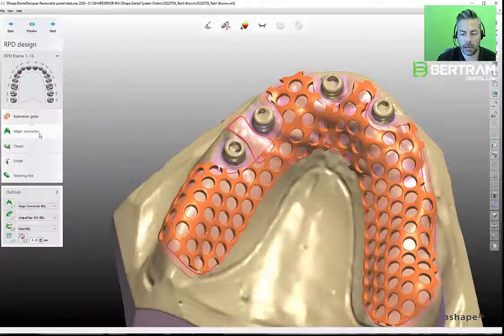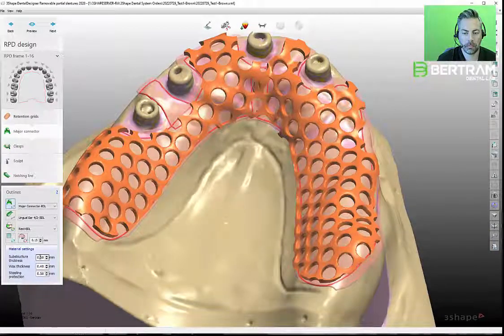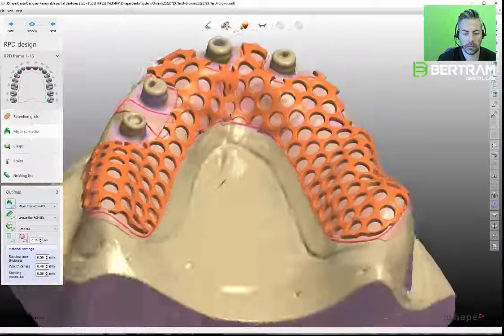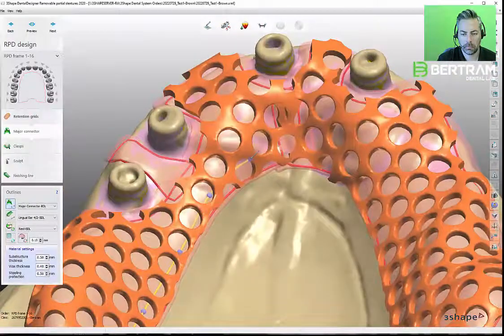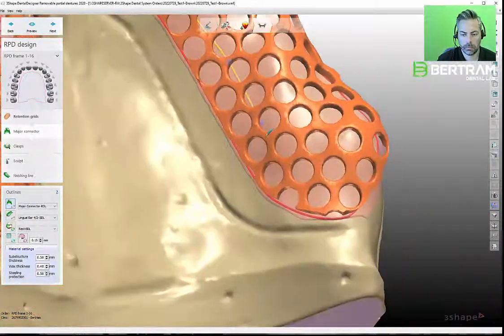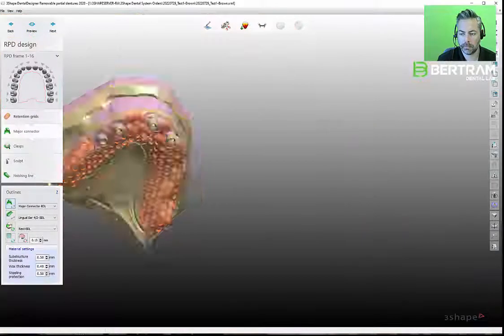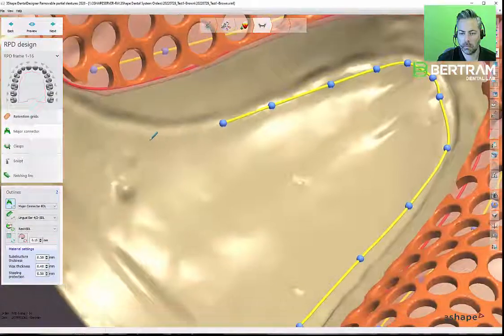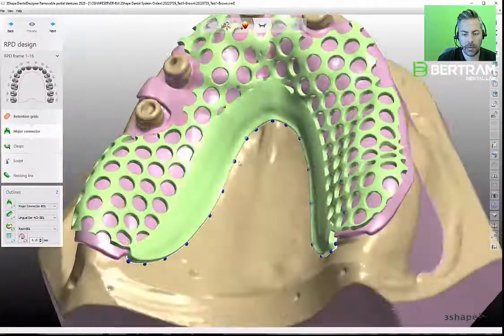Ooh. Let's come back. I'm going to click again, hold shift, scroll, bring this up. And there we go. Very nice laid out.